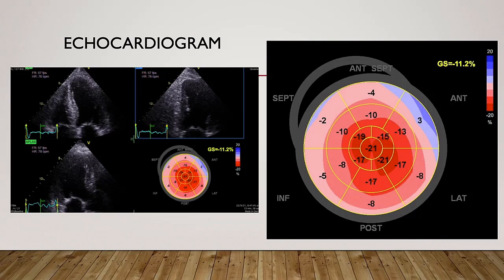His echocardiogram demonstrated septal hypertrophy, which you can see here, and it spared the apex. The strain pattern demonstrated normal strain involving the apex, impaired strain affecting the rest of the heart. This apical sparing is pathognomonic of cardiac amyloid.